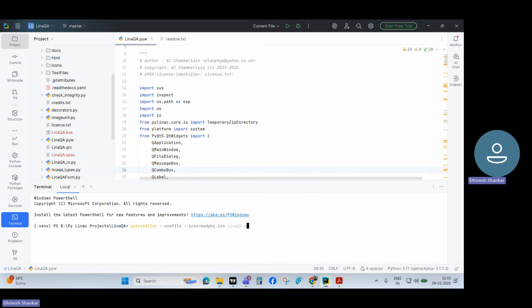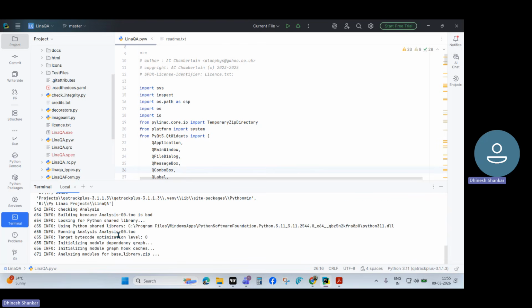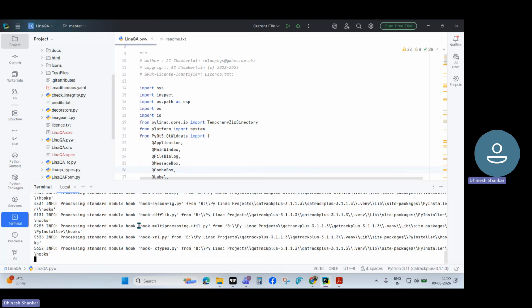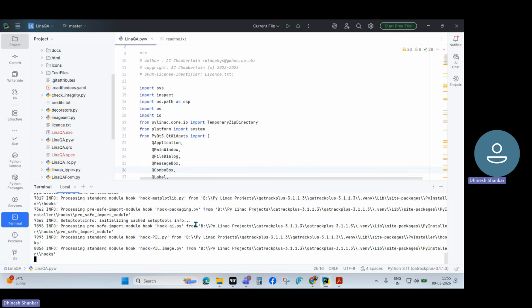Okay, LinaQA.pyw. Once you click on that, it will do the installation process. Fine. This will take nearly 3 to 5 minutes.